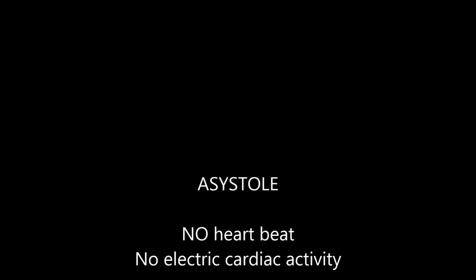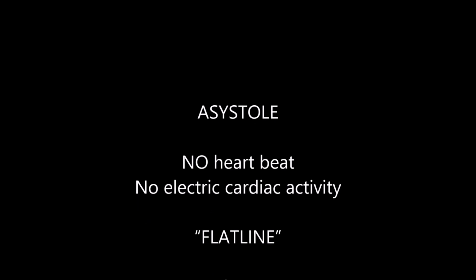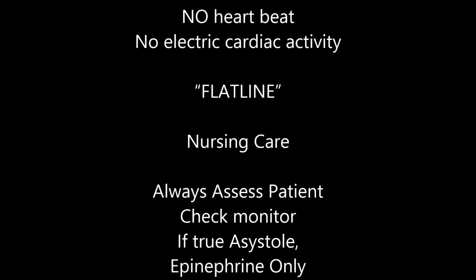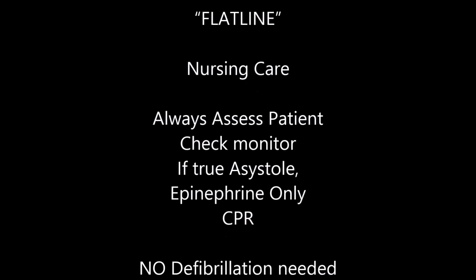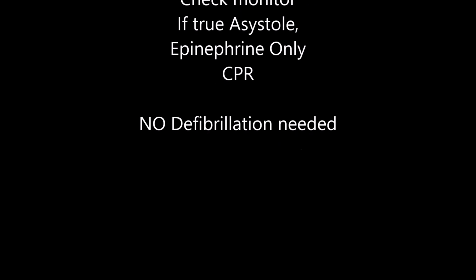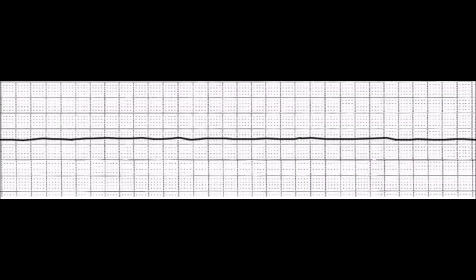If no electrical activity is recovered, asystole results. This is no heartbeat and no heart activity. This is what we call a flatline. At this point, there is no need for electrical defibrillation, but only continuous CPR and continual doses of epinephrine every 3 to 5 minutes according to ACLS guidelines. If at that point no life is sustained, the patient is called deceased.